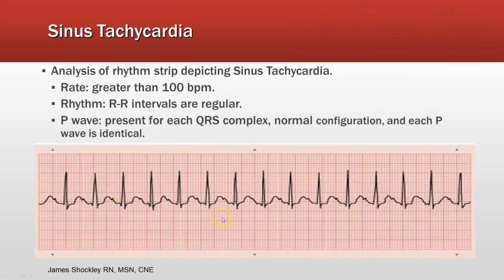Okay. So here, this is the exact same one I showed you on our primer and our toolbox. You can again see that this P is buried into the T. That's not because that's actually what's going on, right? It's only showing you that because it's a piece of paper in a machine, right?